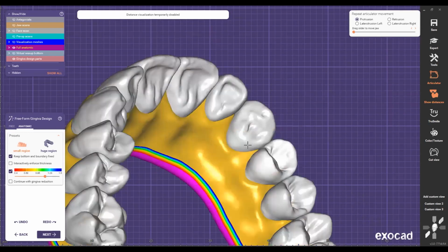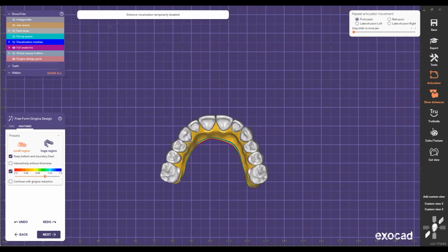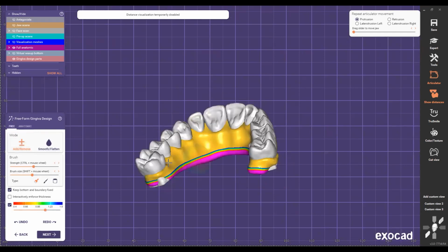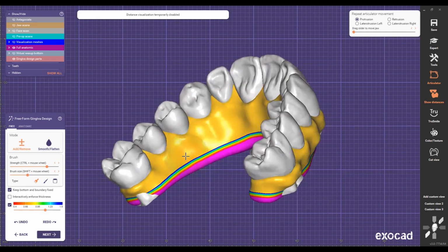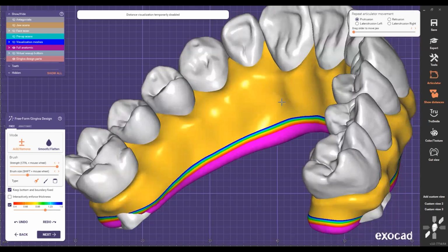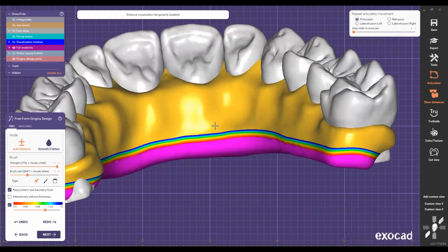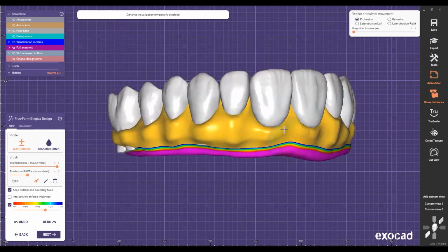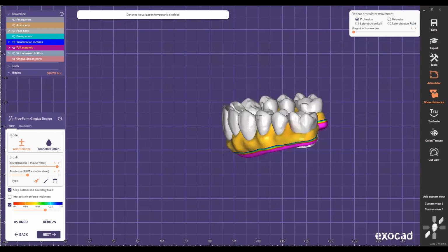Imagine, if you haven't seen videos of how the technicians do this type of case with wax, they add a bunch of wax on there. They do that nice setup. They start melting a lot of wax on top, and then they start peeling off the wax. So that's kind of what I like to do here. I start filling these holes, these concave areas, making it more round. I build a lot of wax right there.